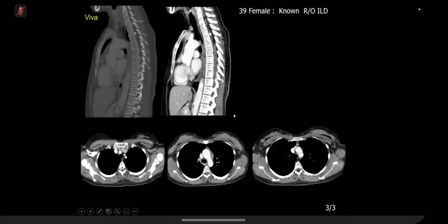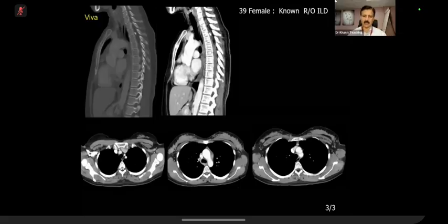Yes, I've got sagittal CT on bone windows and soft tissue, and I've got a hyperdensity at the level of the upper thoracic spine, and that's also associated with low density within the spinal canal. On the axials, it's clearer that there are two foci of hyperdensity within the canal. Then in the second, it looks to be normal cord, and then in the third image, there is low density. So what can you do to evaluate further, just on the CT, I mean to say?